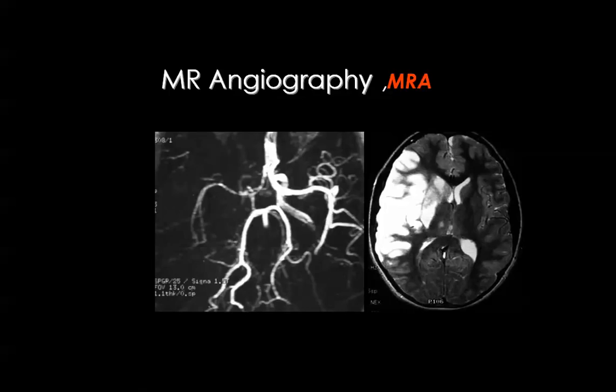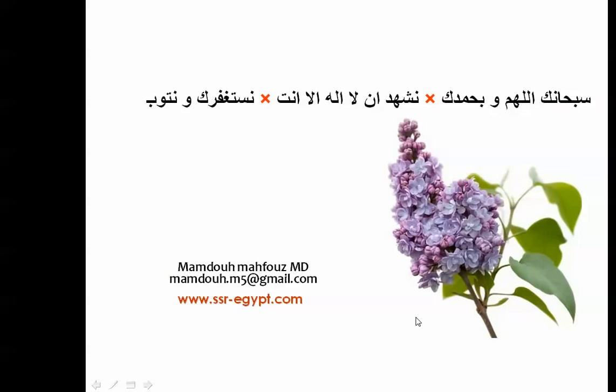And this is an infarction by MRI T2 weighted image in the acute phase compressing the ventricle, and you may use all the capabilities of MRI, including the T1, the T2, the FLAIR, and the diffusion weighted images, and the MR angiography. Like in this case, you see the MR angiogram shows marked attenuation of the middle cerebral artery and its branches corresponding to the site of the infarcted area.